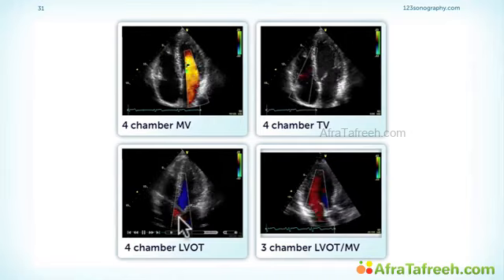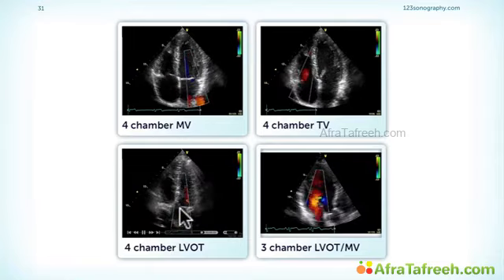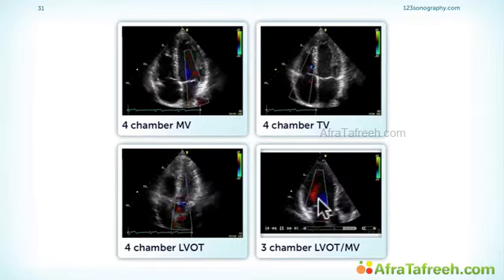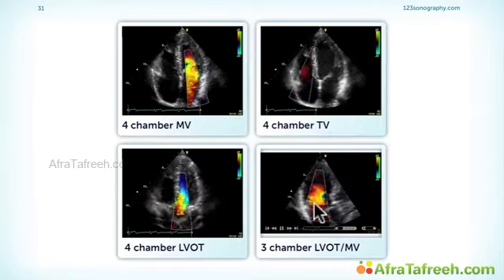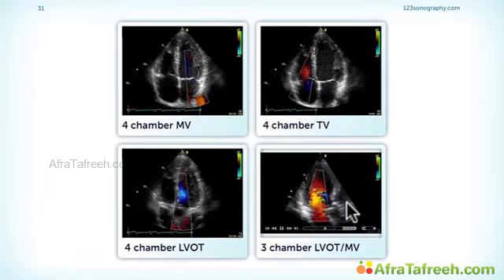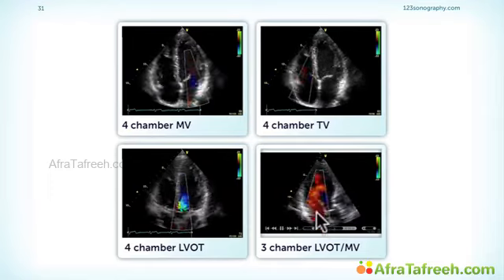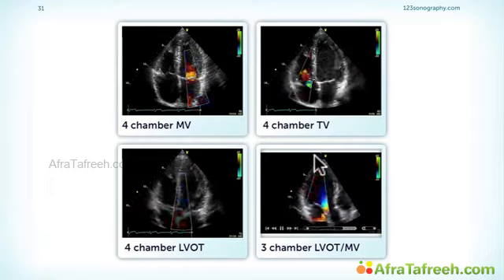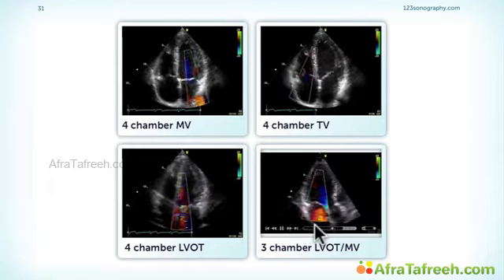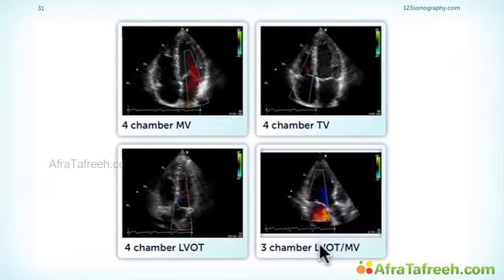The 5-chamber view, where you see aortic regurgitation, turbulent flow, for example, in the LVOT or across the aortic valve, and in an apical 3-chamber view, where you can look at both the mitral and the aortic valve, similar to what you would see in a parasternal long axis view, with the only exception that now you have a different angulation between the color jet and the transducer, which has certain advantages, especially in situations where the jet is oriented more parallel to the ultrasound beam.